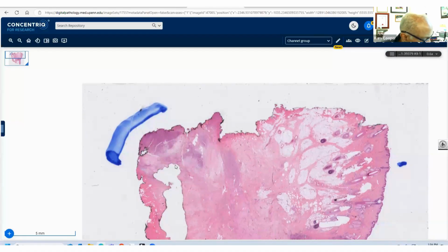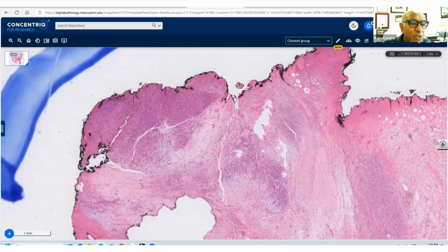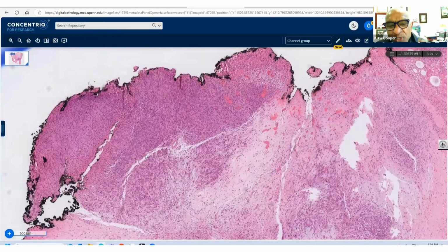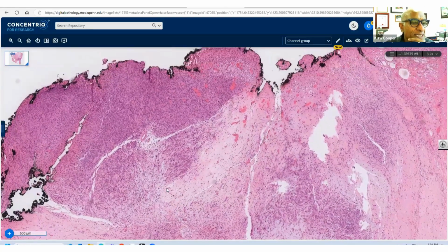Like I said, he's 29, occipital scalp, and there was a previous excision as well. So this was, in fact, a re-excision. And unfortunately, it's right at the ink. So, you would all agree that they then have to go back to get this entire tumor out. But we do have some tumor here to talk about, which is why this got onto the slide set.